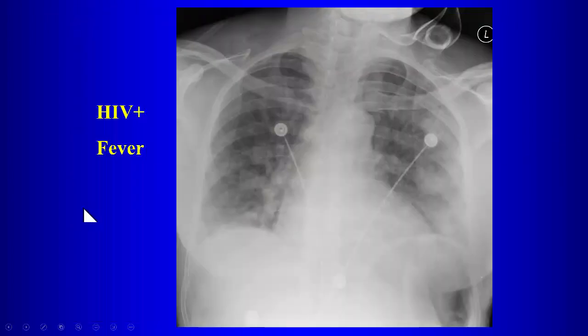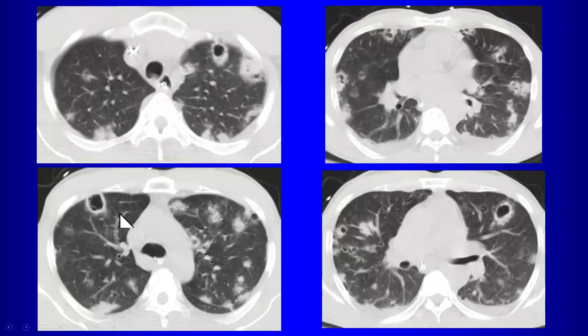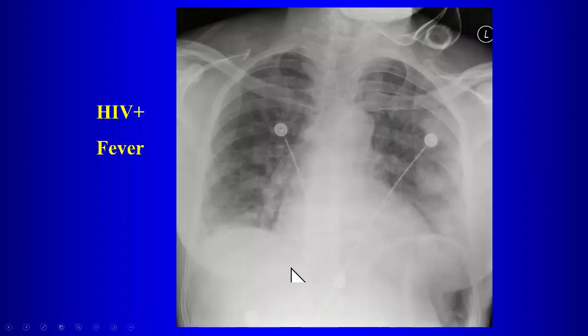All right. There is another patient who's HIV positive, has fever. In the chest x-rays, not much to say, questionable hazy opacities, but very hard to definitively come down on anything. And so it's not unusual in these cases for the ED to ask for a CT scan of the chest to work out what's going on, right? So you should have a low threshold for doing that, and it's surprising the abnormalities you can see on the CT that are very difficult to see on these portable chest radiographs we get from the emergency room.